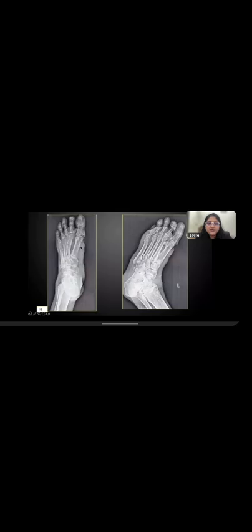Absolutely bang on diagnosis. There is soft tissue involvement. There is increased density of soft tissue. There is air in the soft tissue. There is an ulcer present. There's a defect in the soft tissue in the first MTP joint area, along with the bones showing a little bit of osteopenia. However, the center of attraction in this radiograph is not the bones but the soft tissues. So see the soft tissues and you can imagine what kind of foot the patient must be having with an open ulcer here. So this is a diabetic foot.